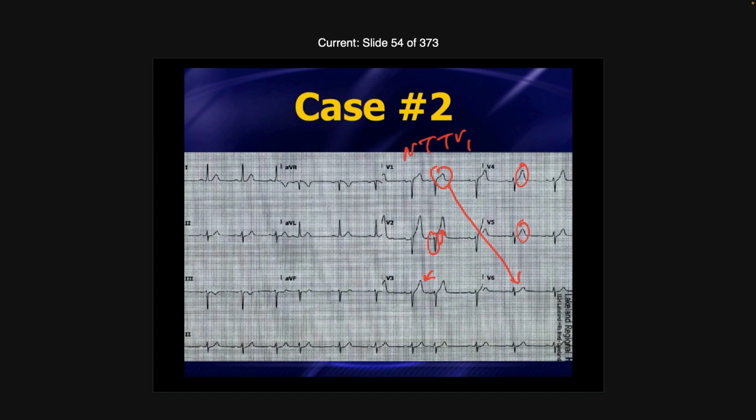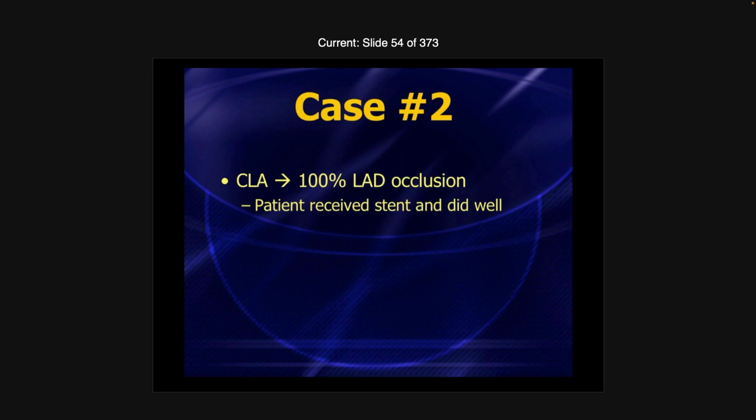When the T-wave in V1 gets very tall like that, that's essentially a hyperacute T-wave, and that predicted exactly what this patient had. V1 and V2 are the most profoundly abnormal to me, but as we mentioned, in V3 and V4 the T-waves have grown also. This patient had a big LAD occlusion.